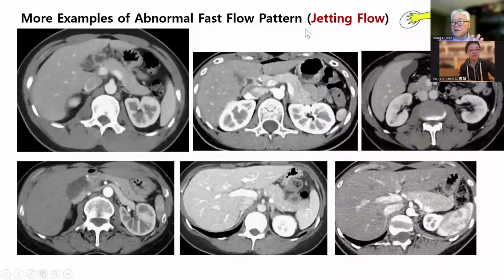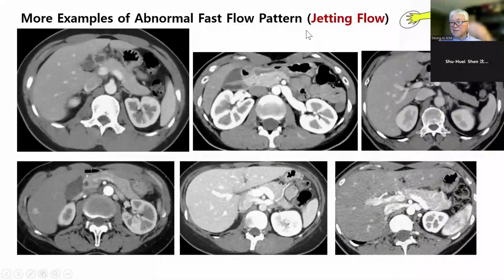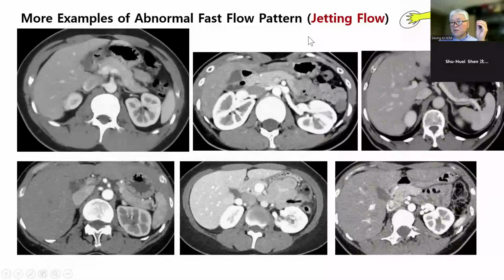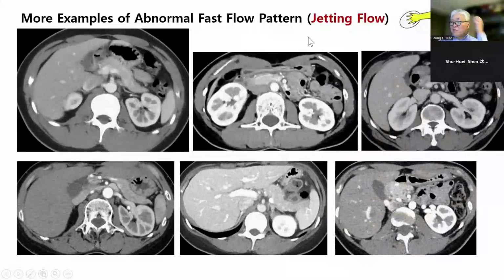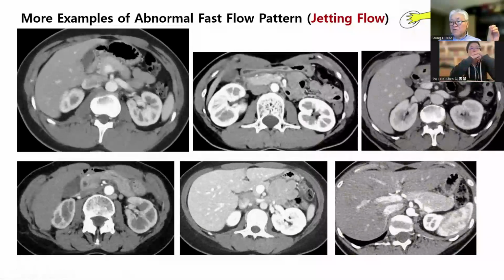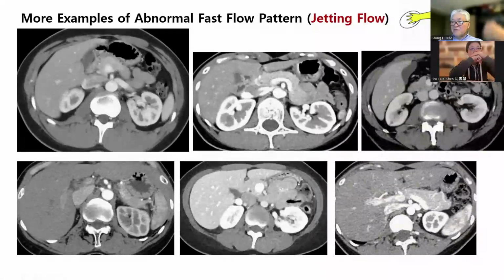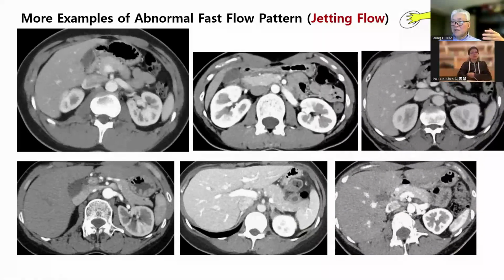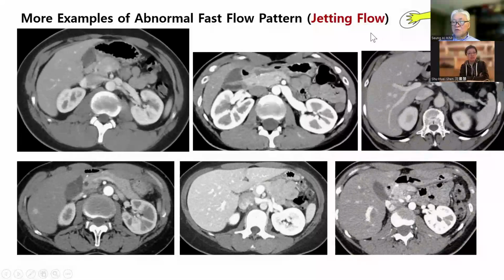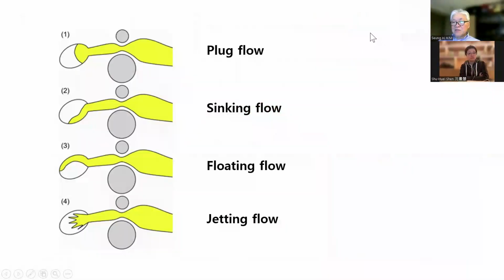So it's quite simple. Whenever I see the CT scan, I try to categorize the flow pattern: pattern 1, 2, 3, 4. If it has pattern 3 or 4, I look at the patient's clinical information and clinical chart, and see if there's any symptom that might be related to Nutcracker syndrome. So basically these 4 patterns. Very simple, but a very useful criteria.